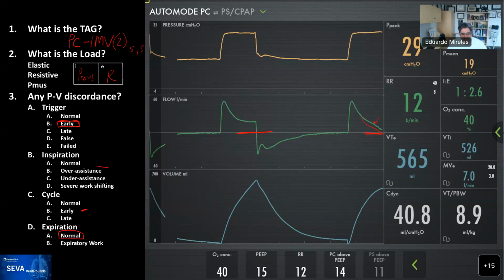So this patient, you can see that the team had tried. Actually, this is a common thing. The patient continued to have this level of desynchrony, and at times it would have a double trigger or multiple trigger. And you can see that the team had tried dropping the respiratory rate. The level of support was coming down on the patient, and we were managing this with sedation.